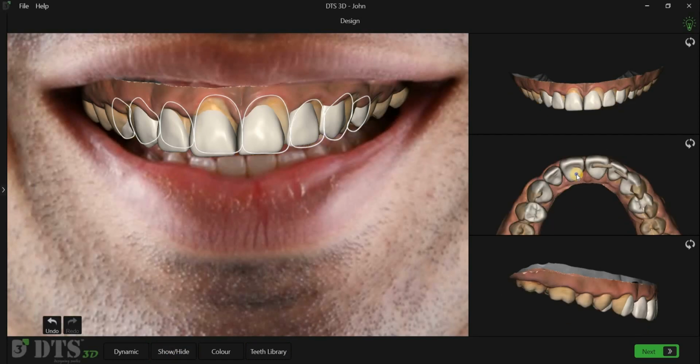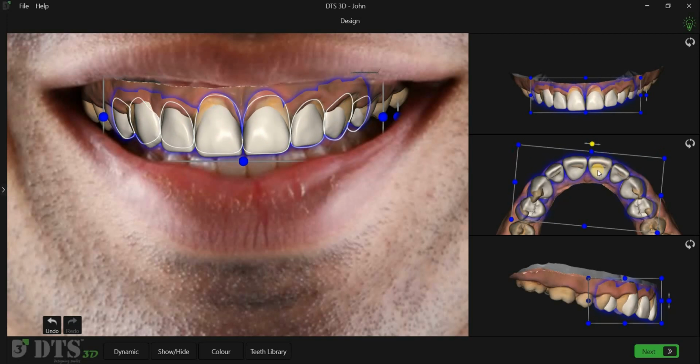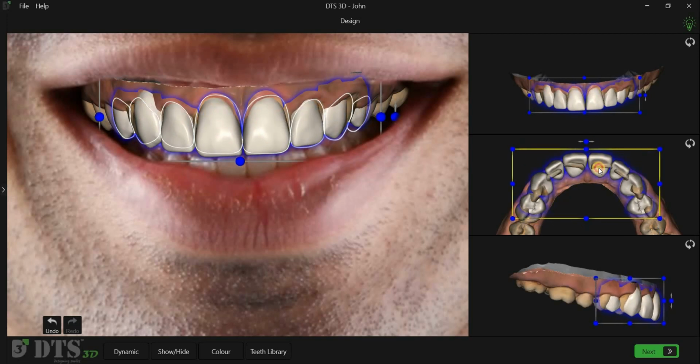Edit individual shells, or the entire group by selecting all shells with Ctrl-A, or right-clicking and choosing the Select All option from the drop-down menu. Use the control points to rotate, move, stretch, or scale the shells collectively.